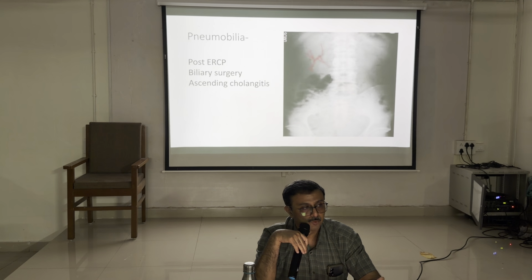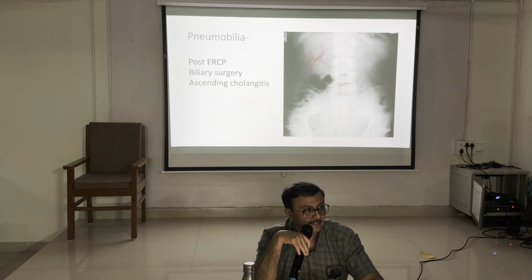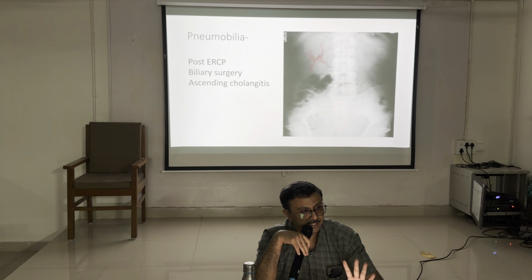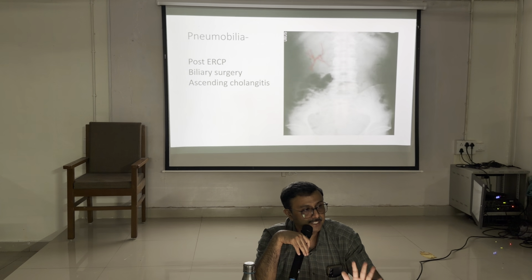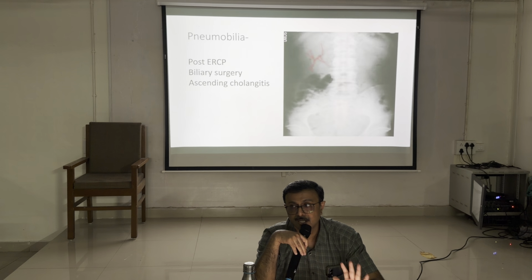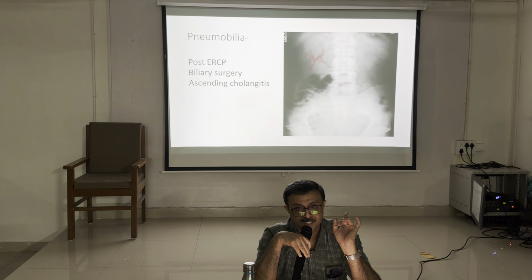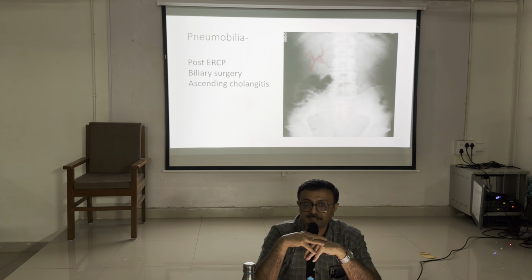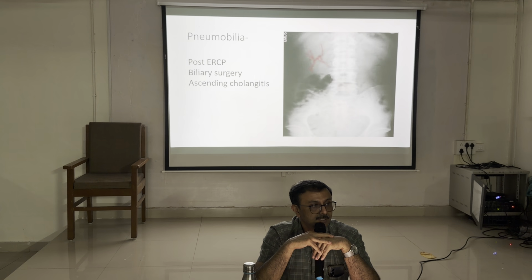Pneumobilia, what is pneumobilia? Air in the biliary tree. What is Rigler's triad? Rigler's triad, it is Rigler's sign. Gallstone ileus. Rigler's triad.